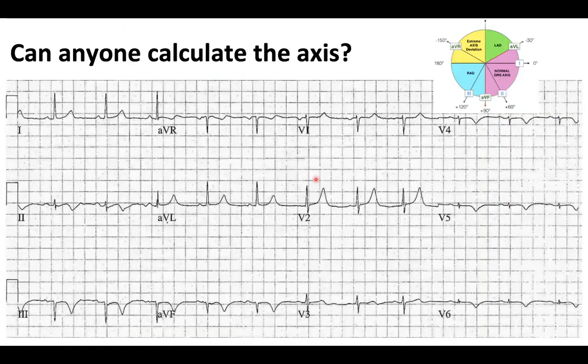Okay, so can anyone try and calculate the axis here? Any answers, Logan?